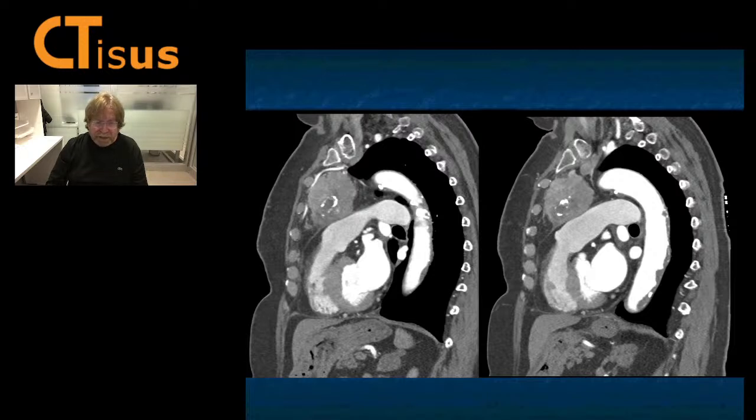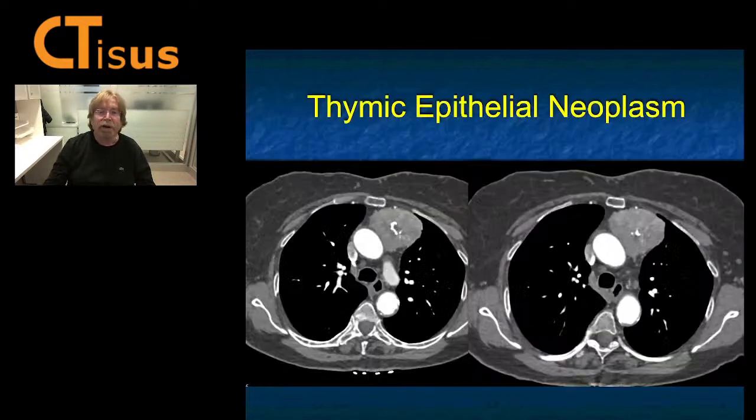Thymus is typically eccentric. Fat, calcification, makes you think teratoma. Patients older, teratoma is less likely, but I don't see fat. So what was this? It was the thymic lesion, but an unusual tumor, an epithelial neoplasm. One of the variants of thymic carcinomas in that category, epithelial. Again, unusual case, but one worth learning about.